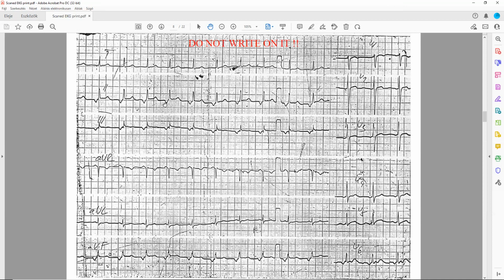Axis? Lead 1 is positive and AVF is equiphasic. This is lead number 1, that's AVF. This is not equiphasic. If you want to choose an equiphasic one, it should be AVL, where the positivity and negativity are about the same.